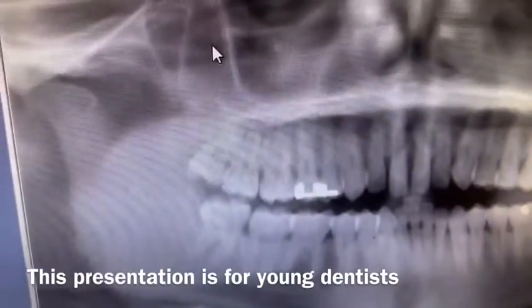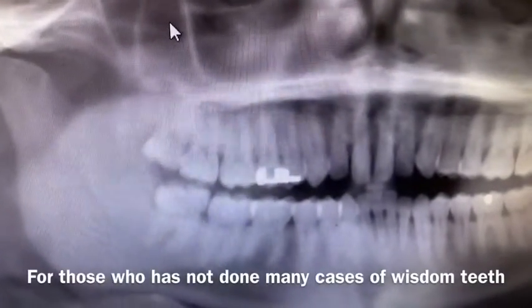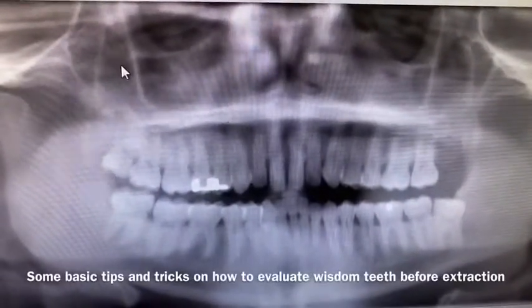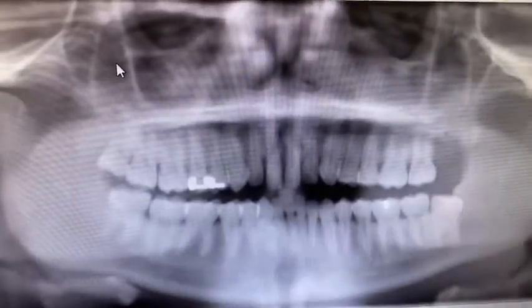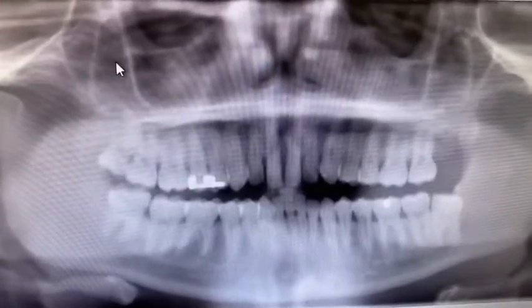You haven't done a lot of wisdom tooth extraction. You want to know a little bit more of the tips and tricks about wisdom tooth extraction, how to identify a difficult case and a simple case. In this particular video, I will be talking to you about evaluating the panoramic x-ray and all the potential x-rays that you need.